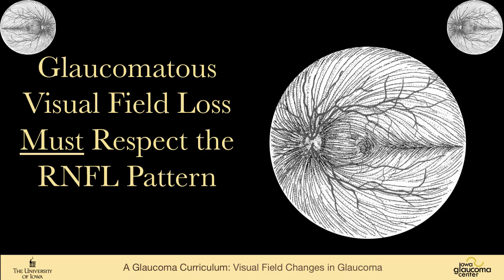So I'm going to put these little pictures of the nerve fiber layer, even though it makes the slides look kind of busy and junky, up in the corner. So every time you look at a field, you're thinking, does this make sense? Does it fit the nerve fiber layer pattern?